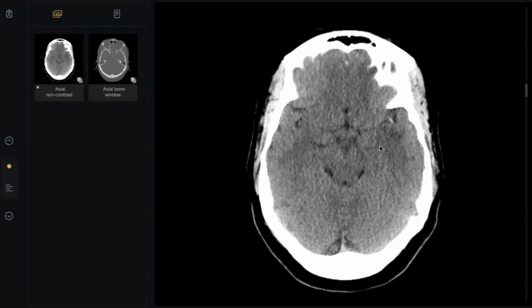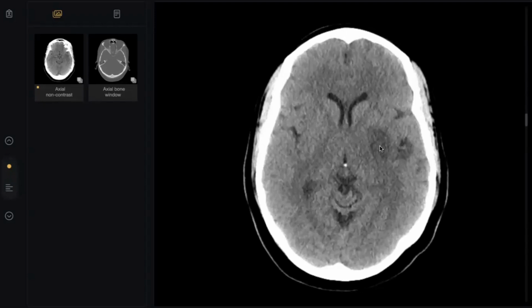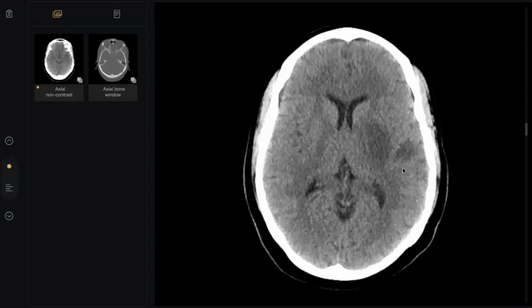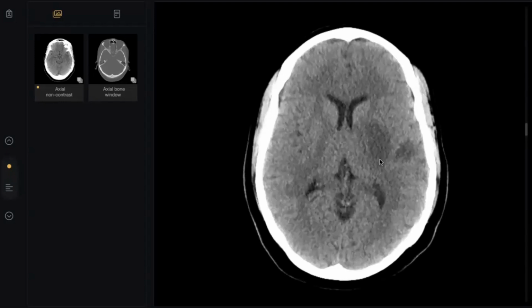Excellent. So in the penumbra sign, we are trying to measure the amount of viable tissue and non-viable tissue. Why? Because here, as you see, my friends, all of this is hypodense, but actually not all of this is infarcted tissue. Not all of this. What happened?